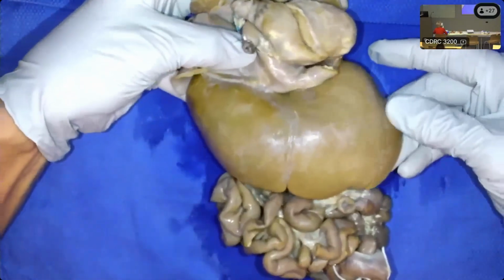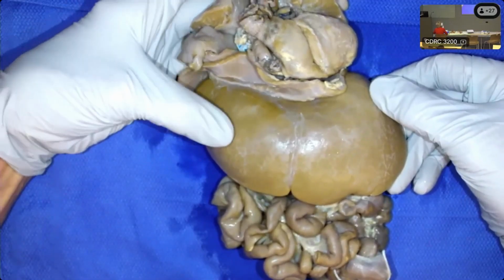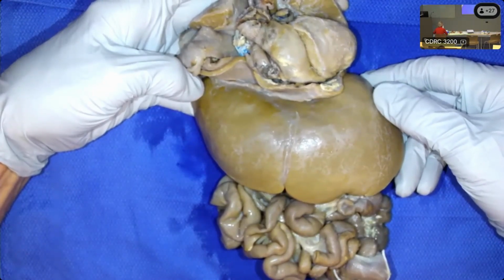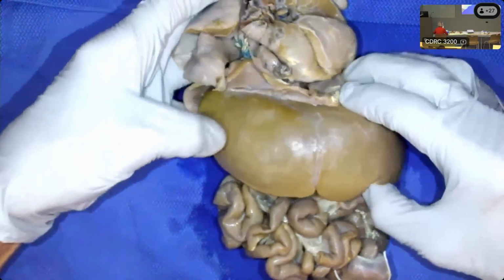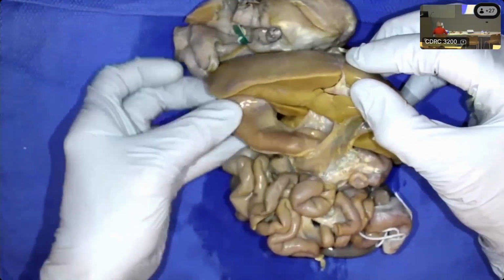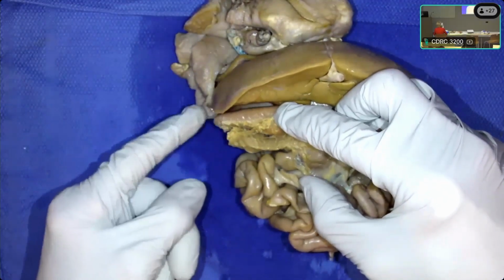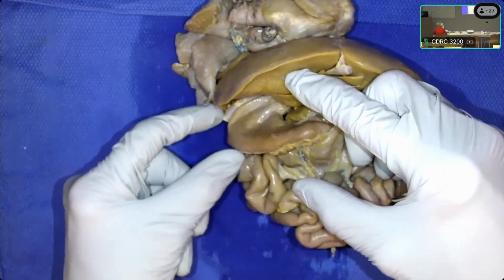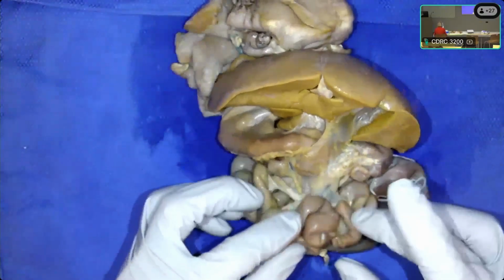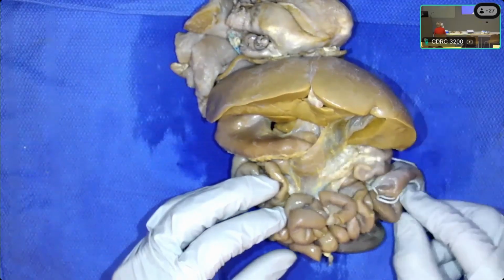So looking at the abdominal organs, you can see the liver is mirror imaged with the large lobe on the left and the smaller lobe on the right. And actually, none of those cases that I've shown you already had a spleen. You can see the gallbladder was left-sided. The stomach was right-sided, as was the pancreas. And there is no spleen, which you would typically see associated with the tail of the pancreas and the greater curvature of the stomach. The bowel is malrotated with the appendix in the left upper quadrant.